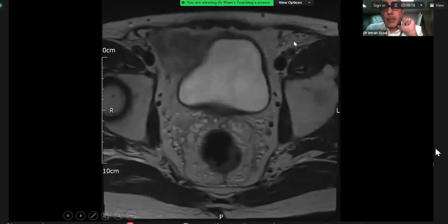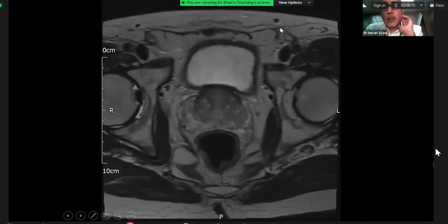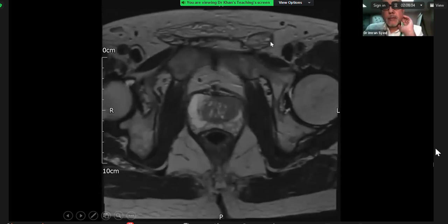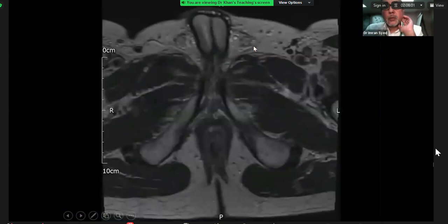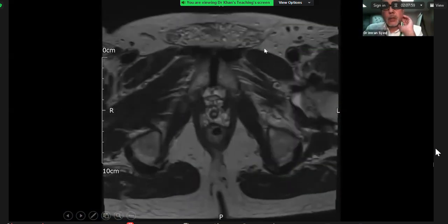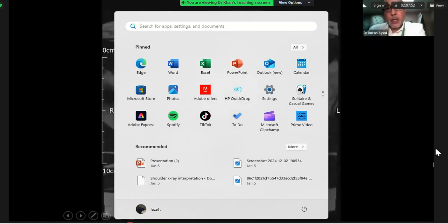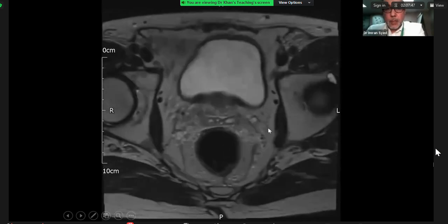And that lateral movement is very important, and you start to now see the early formation of what is the spermatic cord, and that then goes through the inguinal canal just here, and that vas deferens then continues into the inguinal canal into the scrotum. Okay, so calcification sometimes can help in terms of anatomical definition, and so I hope that was a useful delineation of the vas deferens as a whole.